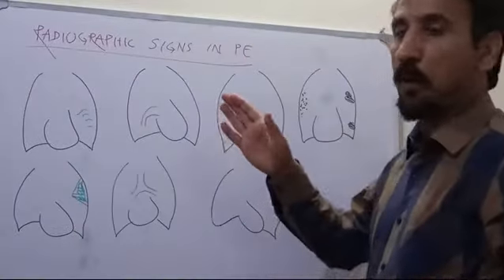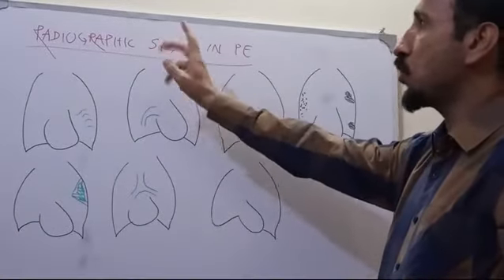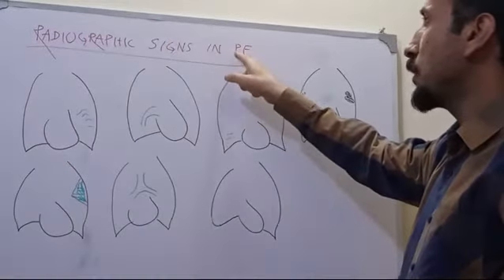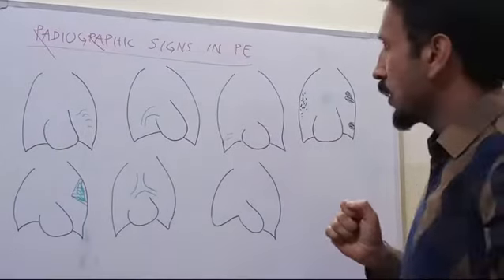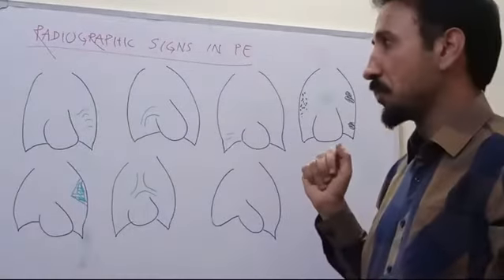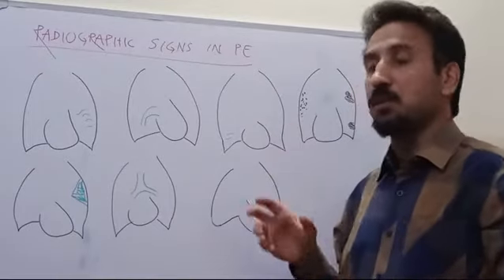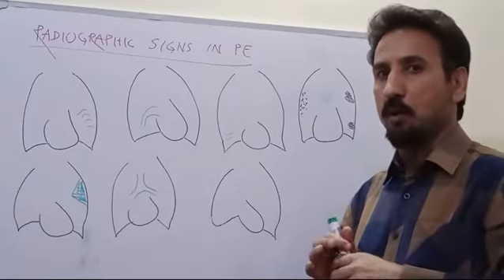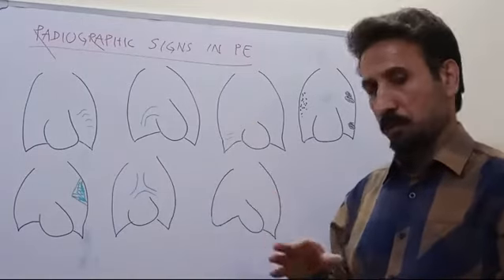Today we have to talk on the radiographic signs on chest X-ray in pulmonary embolism. This is very important because by just looking at the chest X-ray in a patient who has a high index of suspicion of pulmonary embolism, it's very easy to make the diagnosis.